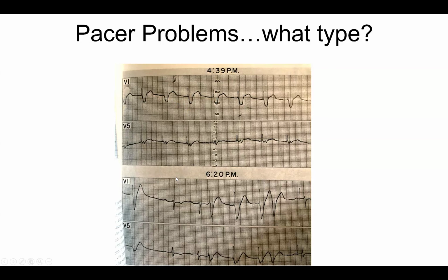This, by the way, just for the record, is an old school Holter. This demonstrates what was better about Holters than, say, Zio patches. What was better was that you would routinely get two leads of the patient because there were typically 5 leads placed on the patient. You might say, well, why did we stop? And they do still exist, of course. You can order a Holter here, although Robin will give you a hard time.